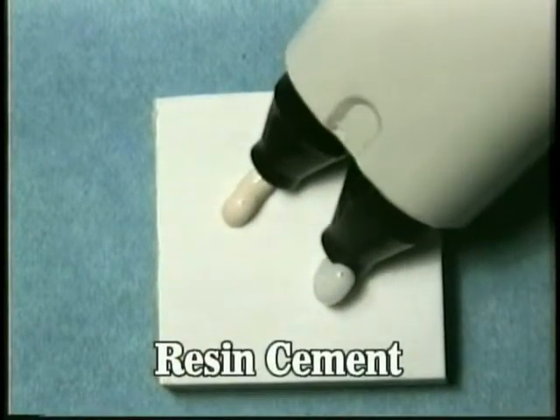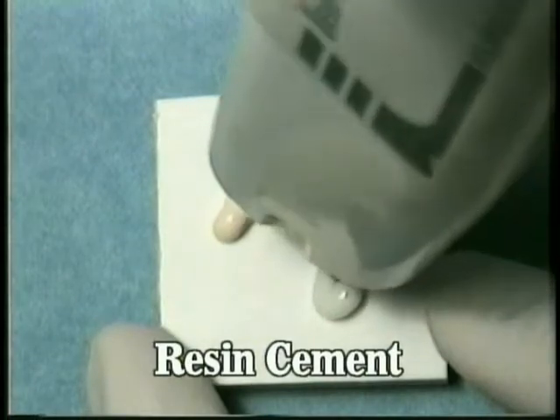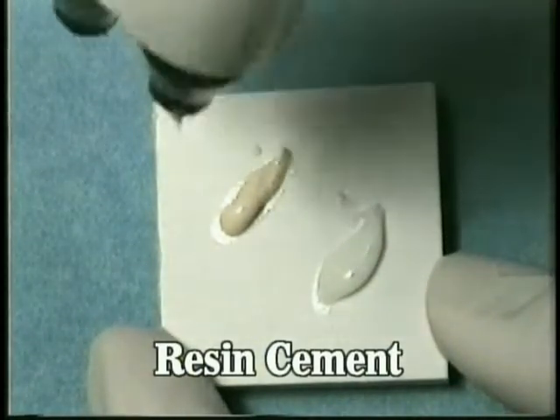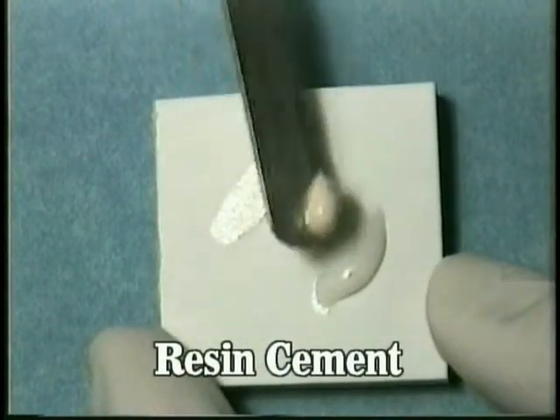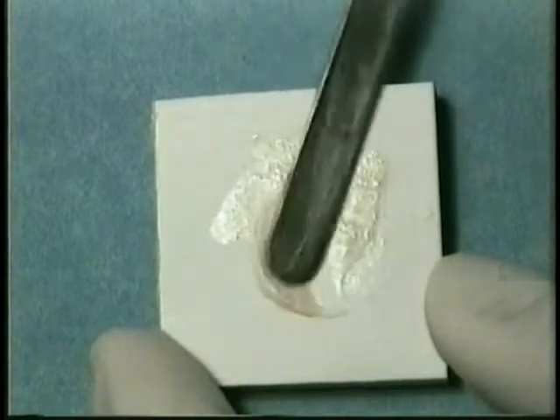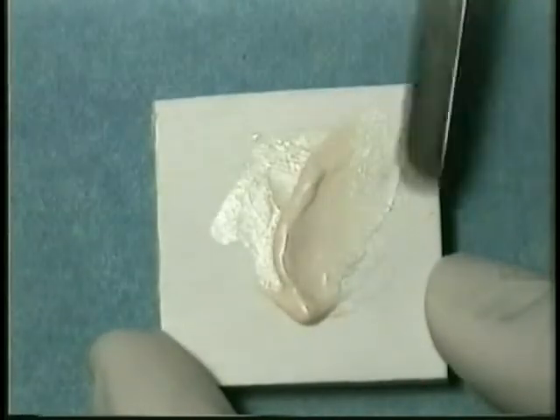Resin cements are very similar to composite resin restorative materials. Two pastes are dispensed and mixed together to form one of the strongest dental cements available today. A primer is used with resin cement to provide adhesion to the tooth.